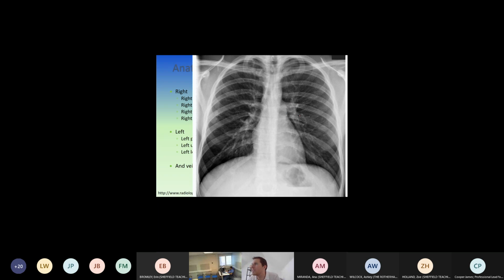What we don't want is any dense white mass, because that could indicate hilar lymphadenopathy or a hilar mass. But these look like blood vessels. So, for example, you can see this one, and it branches off to a smaller vessel there, comes down here, it branches there, there's another branch there, another branch there, down here they're branching there.